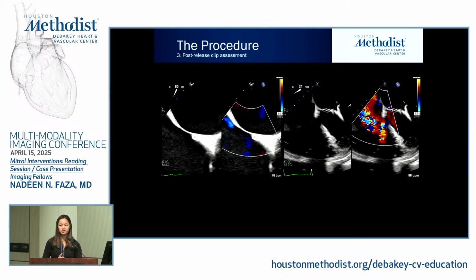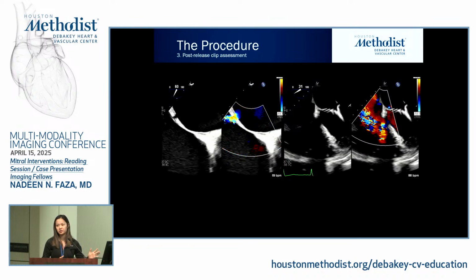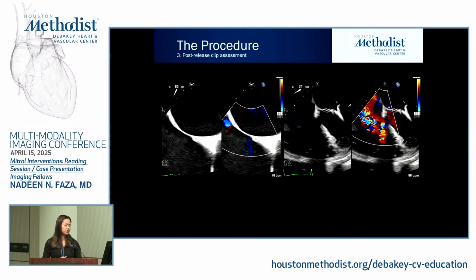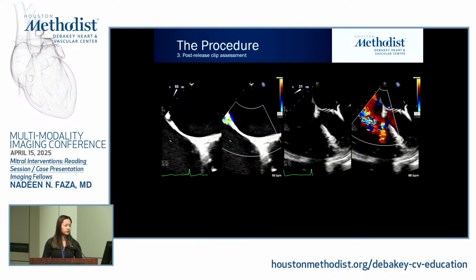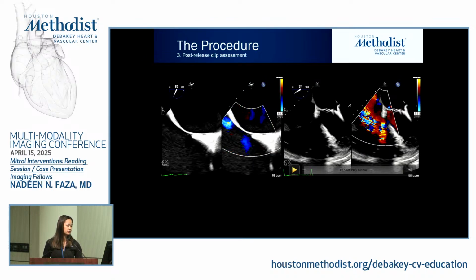In the end, it's important for us to show that there's an iatrogenic interatrial septum that could be having an interatrial shunt. And if it's left to right, then we'll leave it alone usually. And if it's right to left, we will close it with the ASD occluder device.